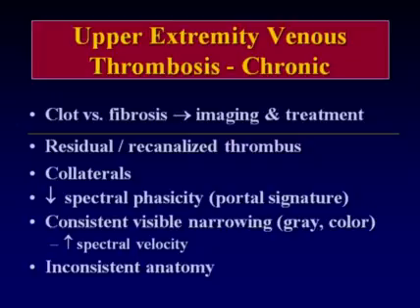First of all, it's important to know in these patients whether you're dealing with residual clot or acute clot versus what often happens in these patients, both in the upper and lower extremity veins. After a thrombotic episode, the vessel may simply fibrose down. So it's important to know whether you're dealing with fibrosis or whether you're dealing with clot from the standpoint of both imaging and possible resultant thrombolytic treatment.